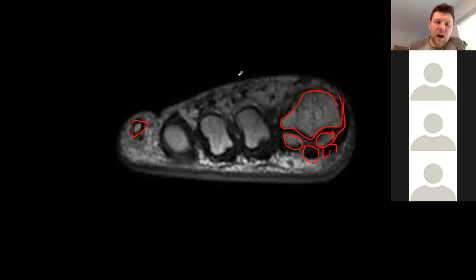If we're looking up top and trying to identify some of the tendons, we'll look at the 3rd metatarsal right here. If we see one tendon coming from directly over the midline of the metatarsal and one coming from a little bit lateral, which one of those is the extensor longus versus the extensor brevis? Good. EDB is from lateral. Wow, that's bad. And longus is straight dorsal.